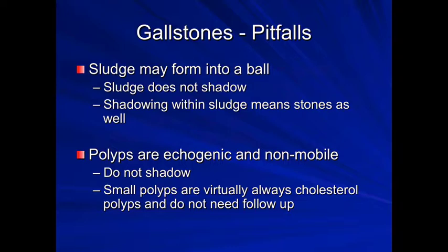If you do see shadowing from inside of sludge, it means it's actually a mixture of stones and sludge. Now, the stones may be very small, but if there is shadowing, it's not simple sludge.